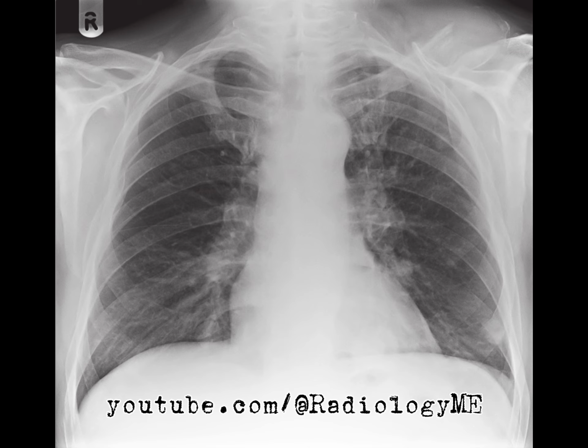And if they wanted to know more about the clavicle, perhaps asking, what's the significance of the absence of the distal clavicle? I'd explain, the distal clavicle is often one of the first areas to show signs of metastatic spread. The fact that it's missing here suggests an aggressive destructive process that's highly likely to be metastatic in nature. The absence of the clavicle, in combination with the pulmonary findings, strongly suggests that this patient has a widespread metastatic malignancy.